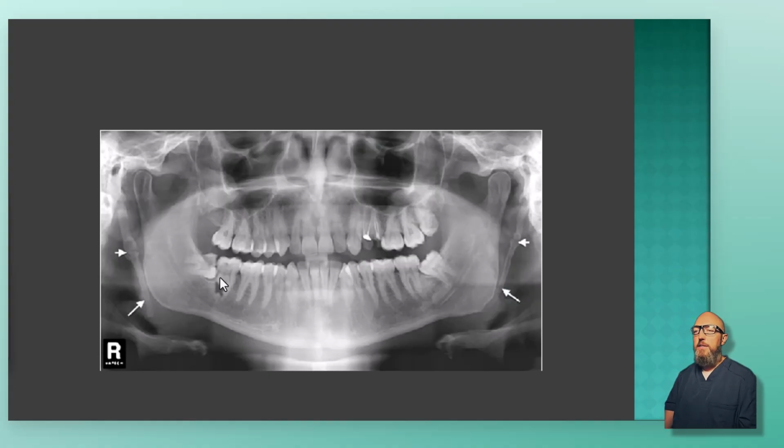What's this one here? Is this arterial or is this a ligament? Give you a multiple choice there. And this just follows the track of the stylohyoid ligament as it extends down from the styloid process. And you can see, as we said, it typically ossifies more from the top, but it can ossify anywhere along that chain. Here's their pseudo-articulation. And so that's just a stylohyoid ligament ossification.